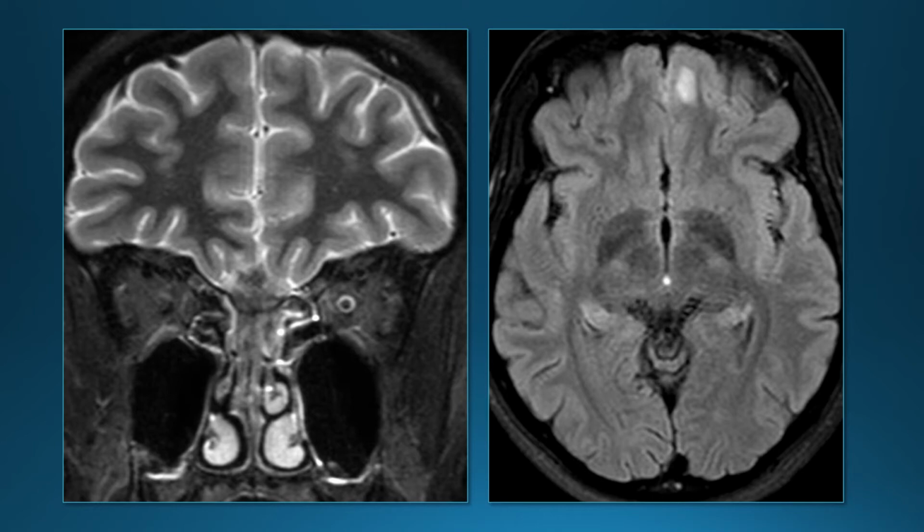And here's a T2 weighted image. And on the coronal, we can see there's still a lot of disease in the upper nasal cavity and ethmoid sinuses, and maybe a little more pronounced intracranial extension here. This one is low signal on T2 weighted images. There's some edema now in the adjacent frontal lobe.